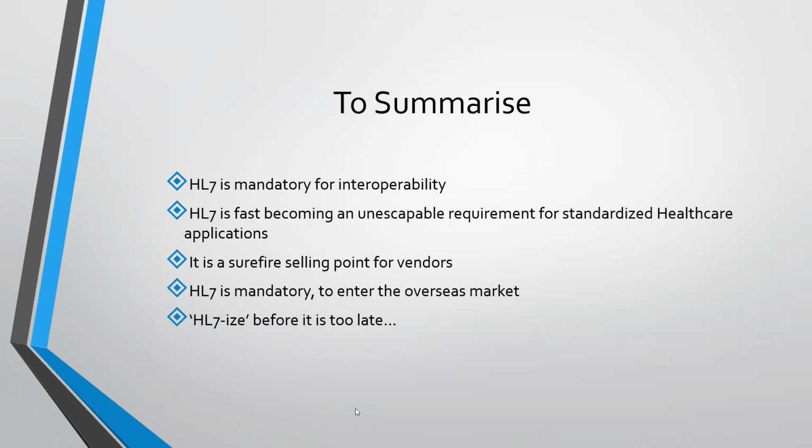While implementing, there may be many times that you have to understand what the structure is, what the field is and all. During that process, you may waste a lot of time. So we have some tools that we can use to break down the HL7 message and give us a complete view of the HL7 message. So we'll talk about such tools.